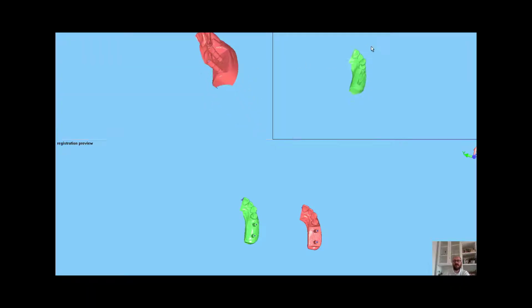I'm working with a mesh editing tool. The registration process passes through two different steps. The manual one, where you are asked to define which surface can be considered as fixed and which one as floating.